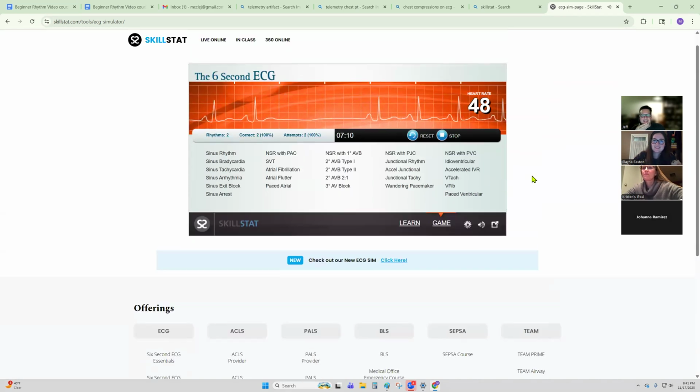Kristen. Oh, God. Pause. Sure, there is a pause. But are the pauses equal, or is that one longer? Hold on a second. I have to look at it. So there's this one, and then there's this one. PAC with compensatory? No, that's. I don't actually see.